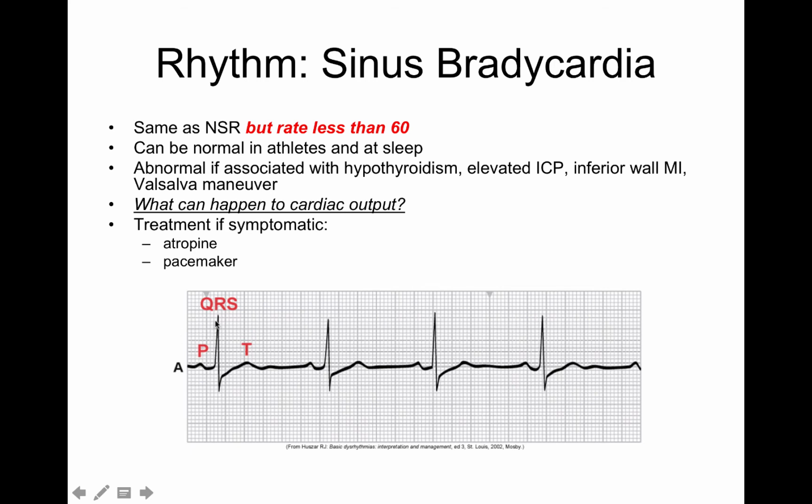So if I was looking at the monitor and feeling for a radial pulse, each time I see a QRS complex is when I should feel a pulse. So this is an electrical picture of the heart. It's not indicating any mechanical capture whatsoever when we look at EKGs.